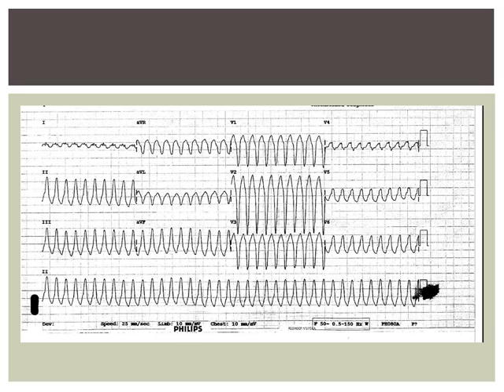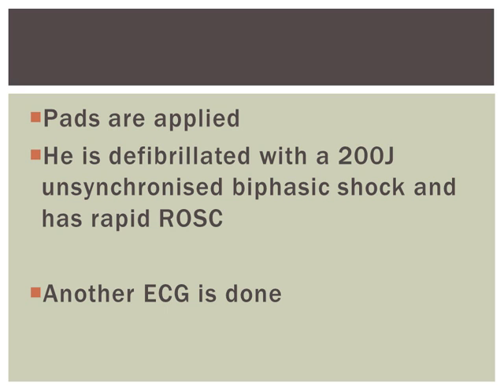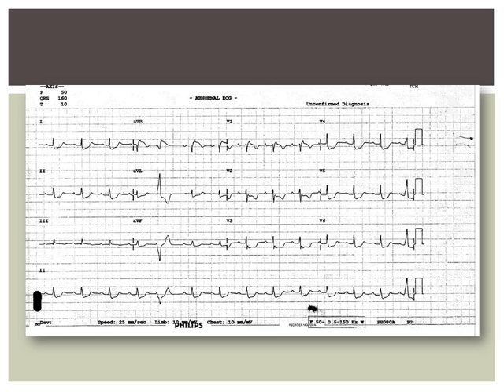Everyone is probably reasonably happy that this is a broad complex regular tachycardia. So pads are applied and he is defibrillated with a 200 joule unsynchronized biphasic shock, and has rapid return of spontaneous circulation. Another ECG is done, and this is the ECG that was performed.